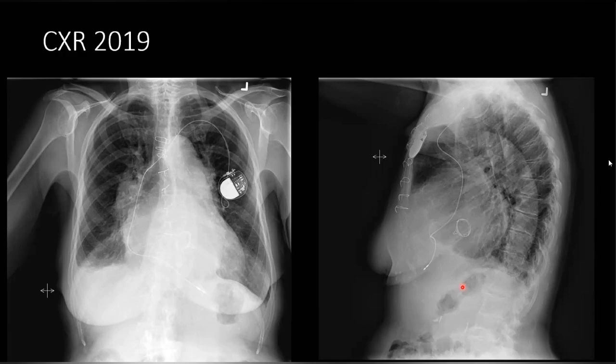Okay. So on the frontal radiograph, see there's a dilatation of the left atrium, but over here there's also dilatation of the right atrium. Yes, this patient had severe mitral and tricuspid regurgitation as well. So what they did was a tricuspid annuloplasty to reduce the diameter or circumference of the tricuspid annulus so that they could get rid of tricuspid regurgitation.